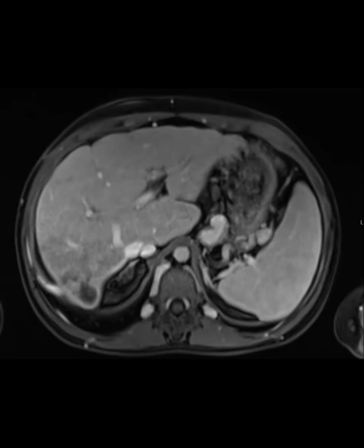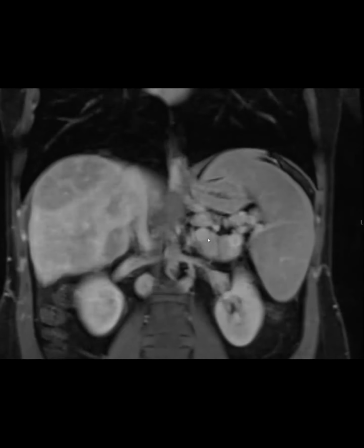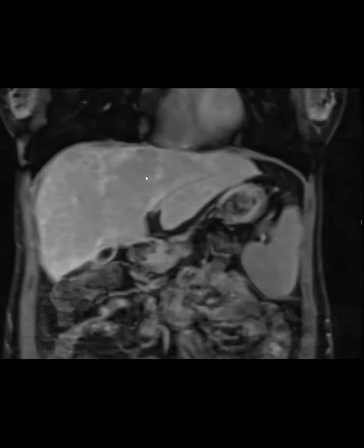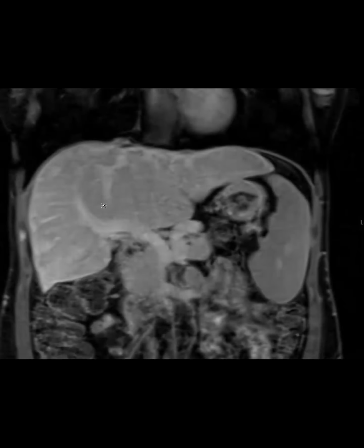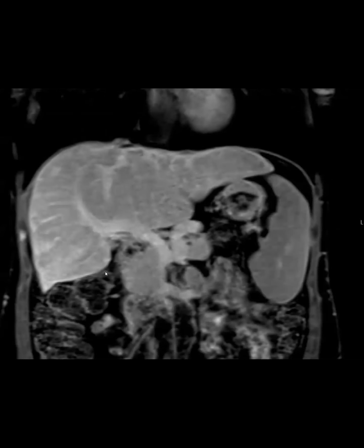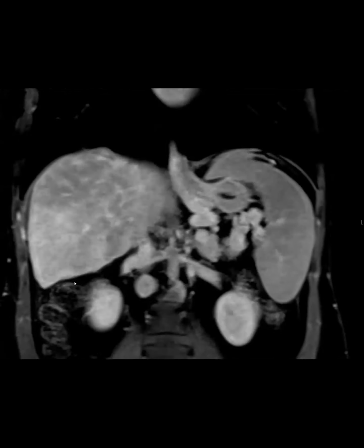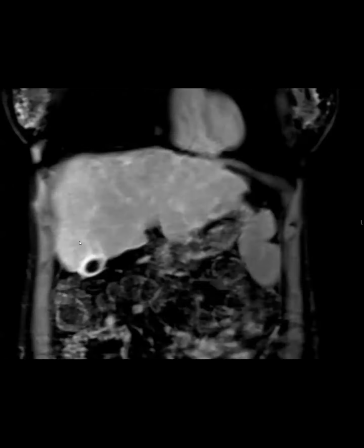Yes. That's why I'm showing the case, just to remind us, because even if they don't come with the indication of Chiari, these are signs that something is different here. I don't think the coronal helps that much because we're now in a later phase, so you don't see the collaterals as well, but you can see there's a lot of weird vasculature here. You think they would have thought, too much trouble, and not bothered with the transplant, or just been better prepared? I don't know.